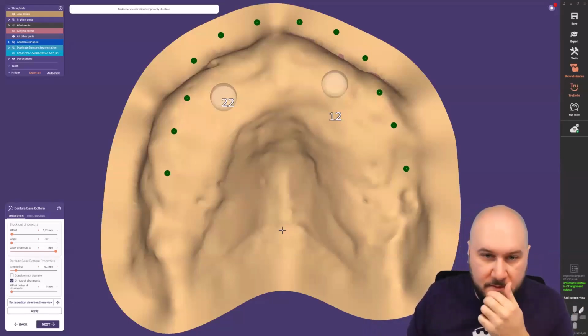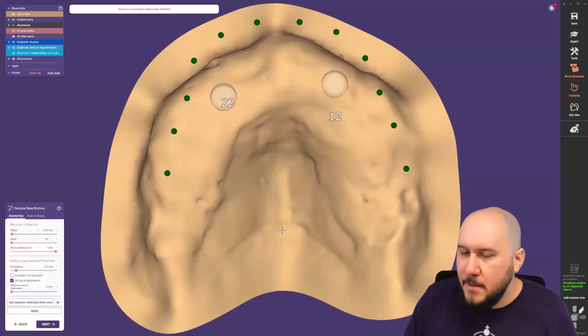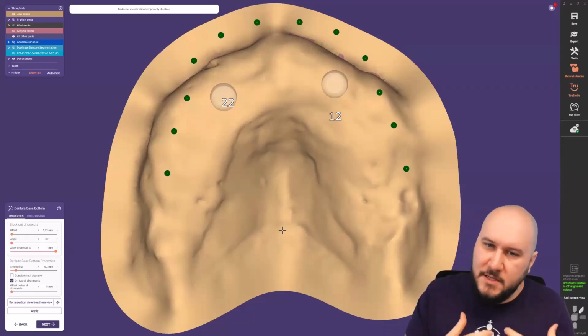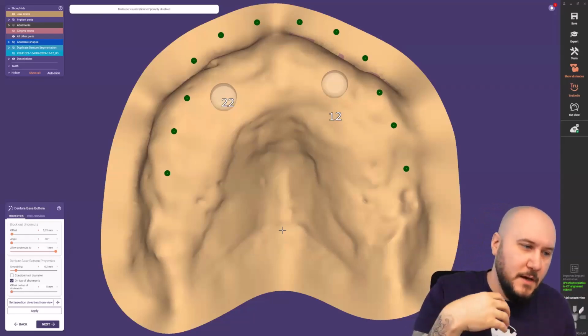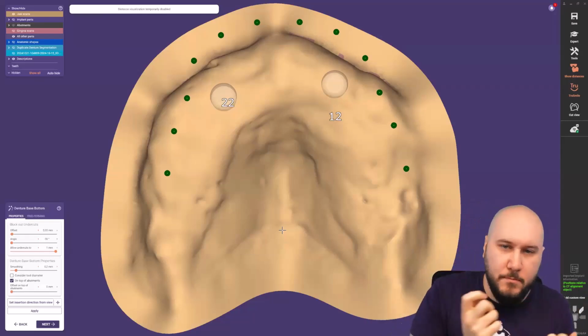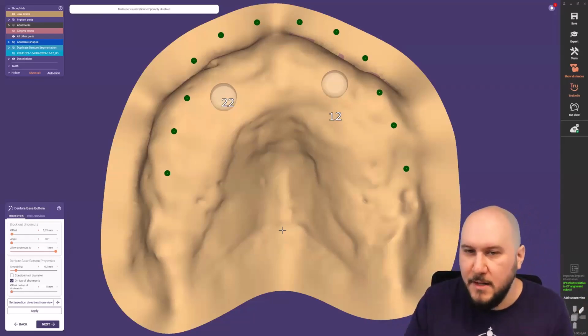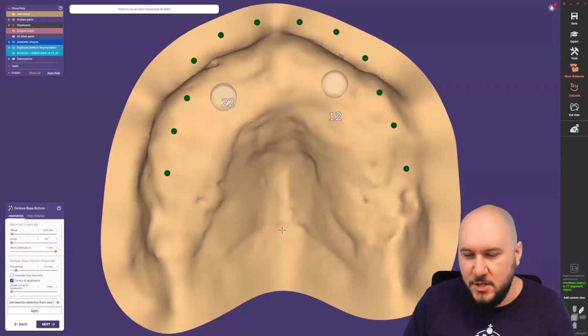Everything is normal. Everything will go through the normal workflow, and we want to show it because it's super easy. Sometimes people say, oh, we want to implement a prosthetic base out of the implant workflow, and then we have to measure things and implants and that. No, if we have the immediate load workflow integration, it's super easy just to take that one as a placeholder.